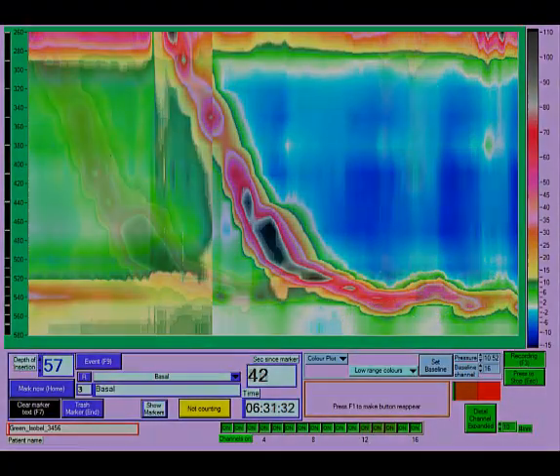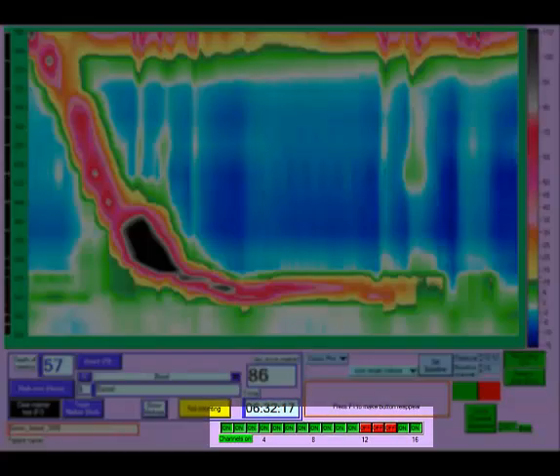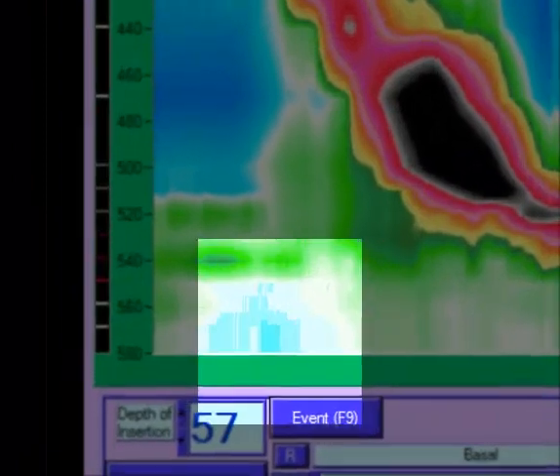If a channel is not displaying correctly, you can turn it off in the Channels On control at the bottom of the screen. But obviously this indicates a problem with the perfusion or the catheter and should really have been sorted out before the study began. If you turn a channel off, the catheter representation changes, with a red line appearing in place of the white line at that level to show that the channel is turned off.